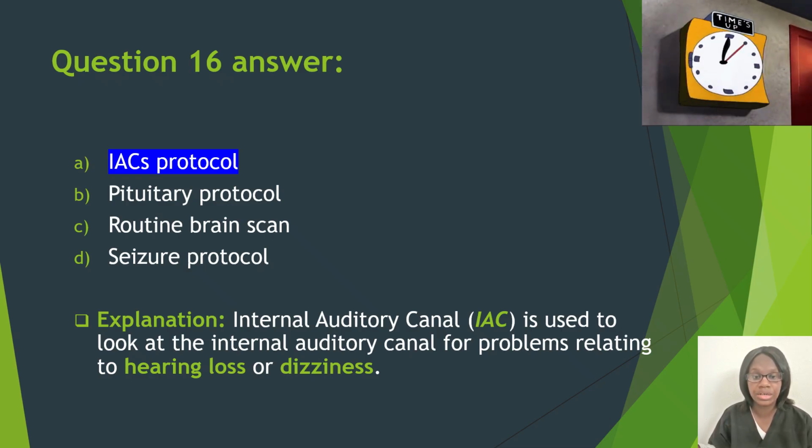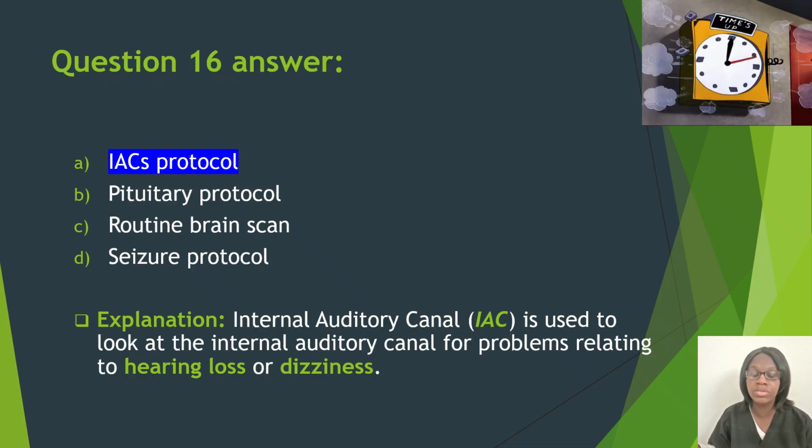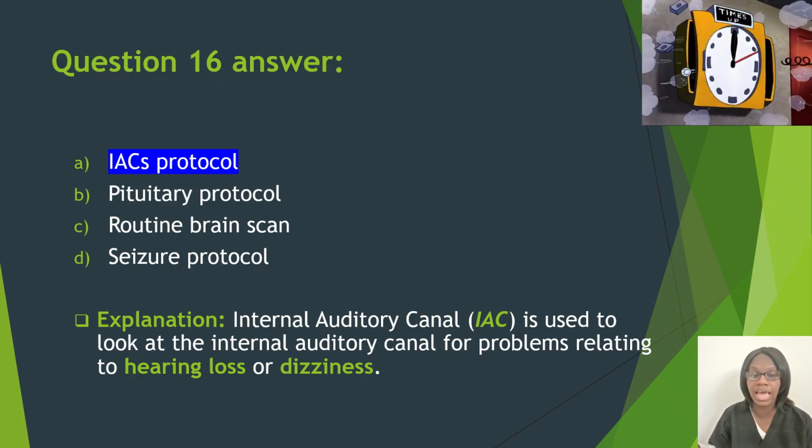IAC stands for internal auditory canal, and it is used to look at the internal auditory canal for problems relating to hearing loss or dizziness. So just make sure you know what I have highlighted.